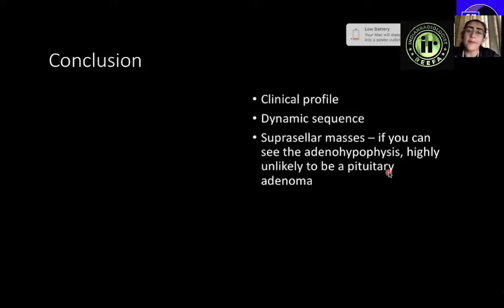Clinical profile plays a very important role. Dynamic sequence, especially for patients with microadenoma, will play an important role. And if you have to remember only one thing, remember this. If you can see the adenohypophysis, it is not a pituitary adenoma, it is some other lesion.